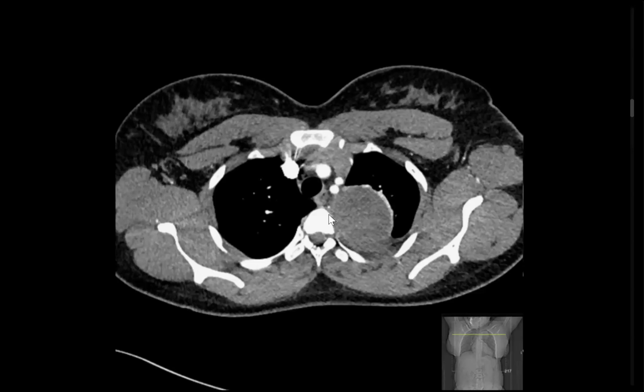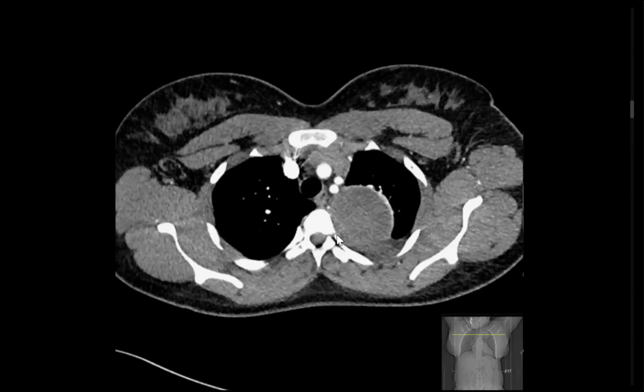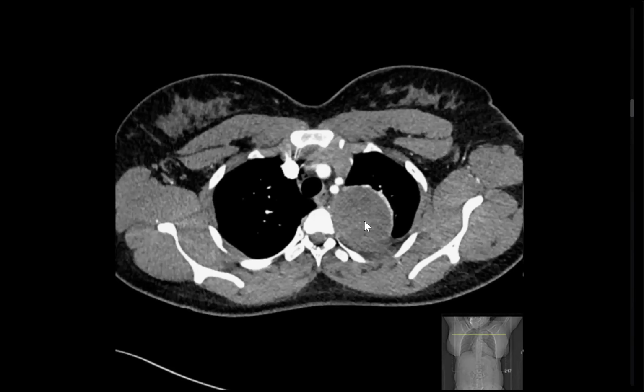You mentioned the smooth lateral scalloping of the vertebra. You see here, the vertebral body is bulging to the side, but here it's indented, smooth indentation, reflecting longer period of time and benign nature of this lesion, and solid appearing. It's hypo-enhancing. I may ask you, for example, maybe cyst with dense content. How to differentiate solid from cyst? I will do HU density. Yes, measure the Hounsfield unit. For example, it's 40.